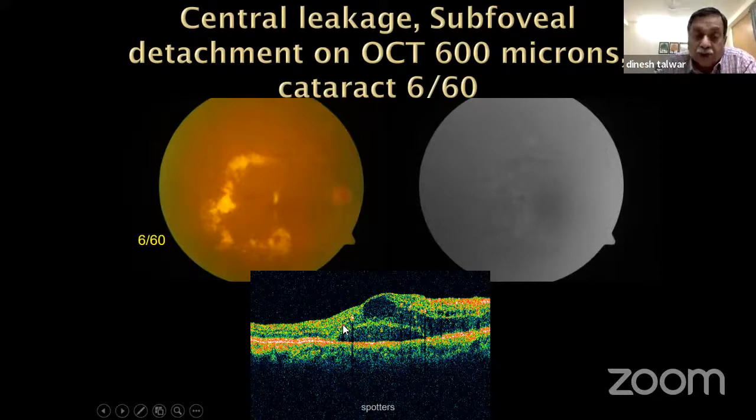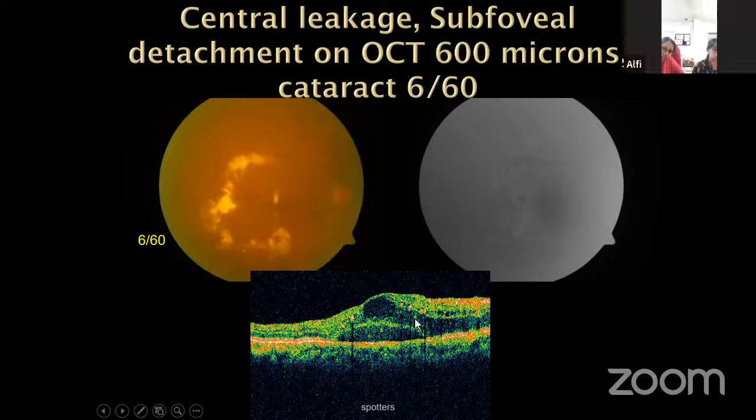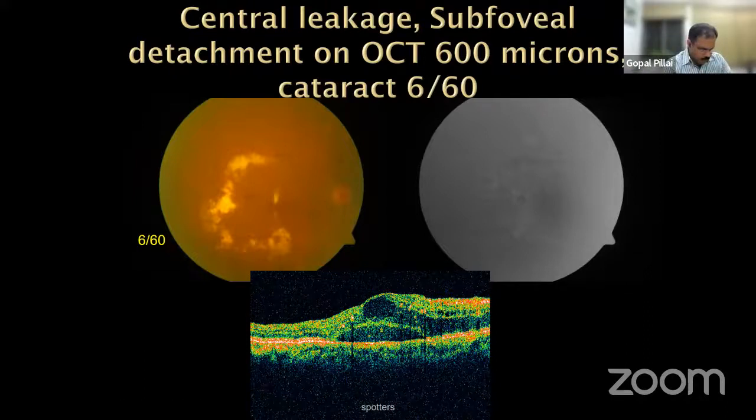Do you see what is happening? What is that black line there? This one. Yeah. Backscatter from hard exudate. Yeah, you see some. So if it's a very small hard exudate, you could miss it. But in big hard exudates, what do you see? Shadowing. Yeah. So shadowing means this is not.